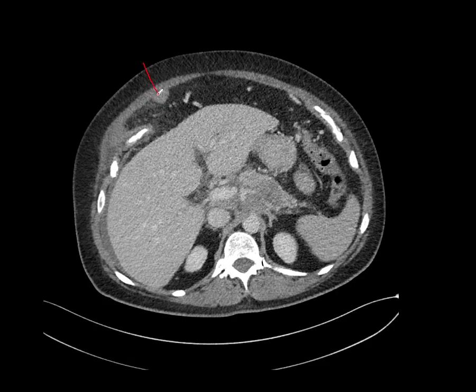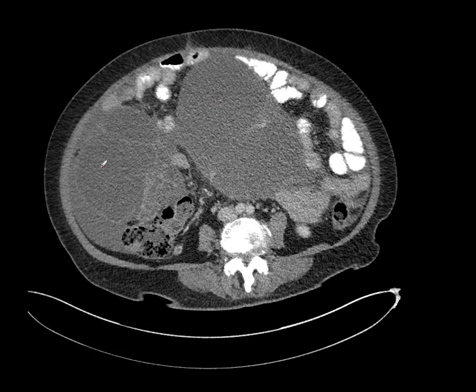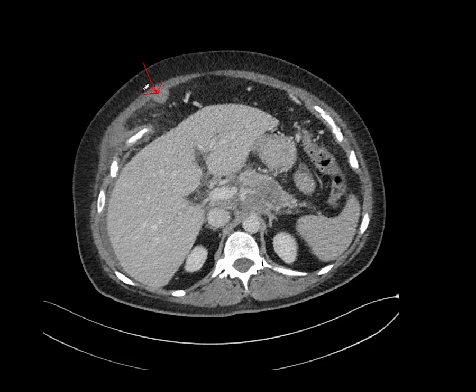And it was easy for one of my colleagues just to take a biopsy from this sample with no morbidity for the patient. And of course, the problem with taking a sample elsewhere was it might have been difficult to identify a solid area in which to get good tissue. We might just have got some fluid and a small bit of tissue. The pathologist might not have been happy with that. But this area here is very good for a biopsy because it's solid tissue, it's close to the surface, there won't be any morbidity here. We just have to watch out to make sure we're not going into the superior epigastric artery, but we should be okay there.